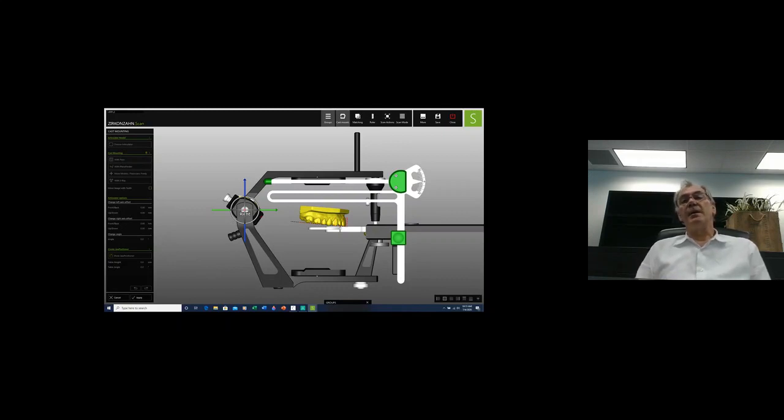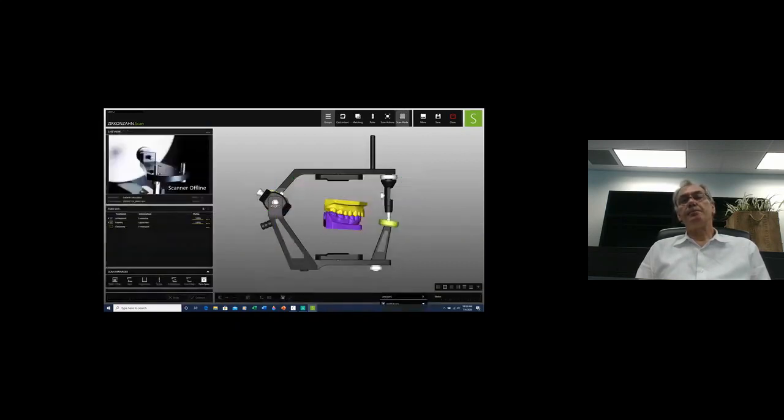We determined that by utilizing the plaster plane, and we set it to a medium pitch, which is around 6 to 7 degrees. The models were mounted manually in the articulator, and we performed a functional evaluation of the teeth surface, and we had an idea of more or less what the function was in relation to this specific type of setup.